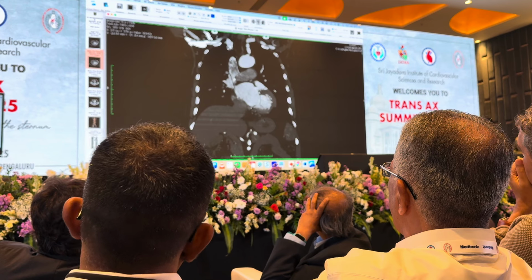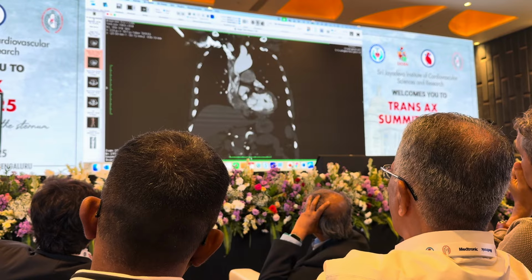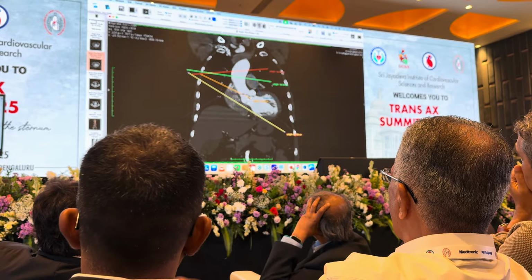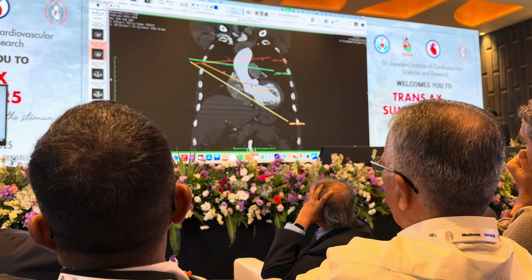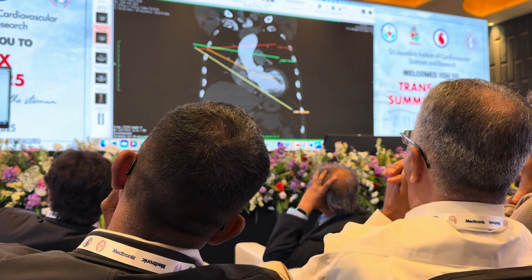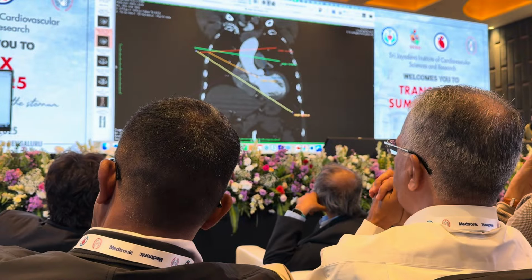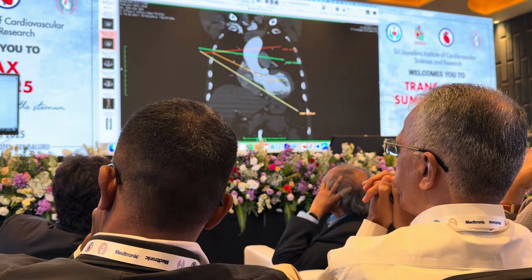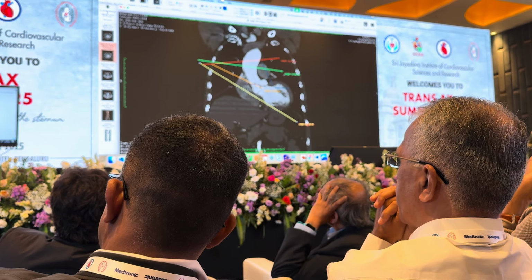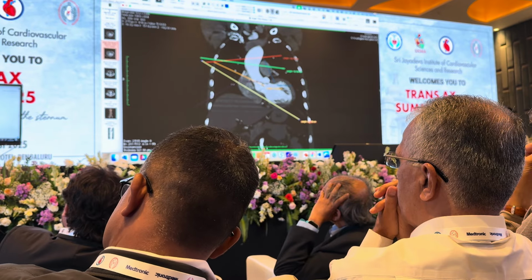And also you can get other information like the pulmonary vein. Everything is here. You see the pulmonary vein. You want to put the left vent here. This is nice. I leave the pointer there. I will certainly be in front of the pulmonary vein. It will be possible to put the left vent there. And then I have a rough information about the aortic valve, very calcified, fibrotic like this one, small annulus, big annulus, small root. So here you get all the information to understand if your candidate is a good one for transaxillary AVR, and you can predict how your working positions, ergonomics, and view will be when you're doing the operation.